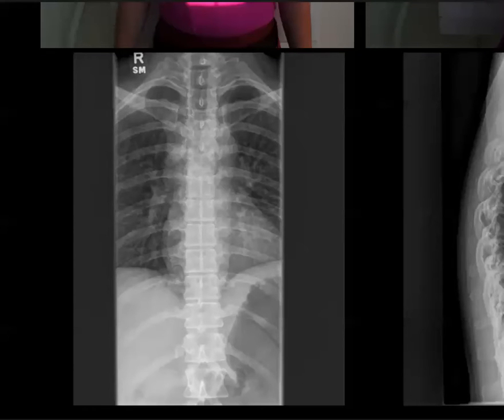All right, for this we have a nice countdown. We have the very first vertebra starting right here with the rib attachment that comes around that's nice and curved. That is the first rib. So as we count here, we have 1, 2, 3, 4, 5, 6, 7, 8, 9, 10, 11, and 12. Additionally, we can see that lumbar vertebra number 1 does not have that rib attachment. So due to this particular patient, we get to visualize all 12 with the AP thoracic spine.